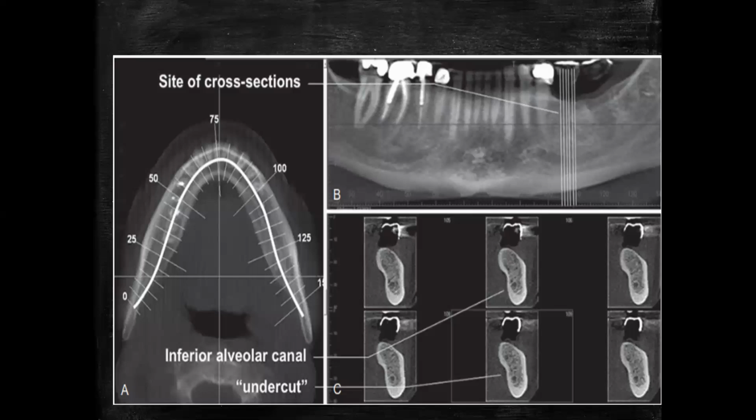In case the interslice distance is 2 mm and slice thickness is 1 mm, the distance between 100 and 101 would be 2 mm, and 101 and 102 would be another 2 mm. So I will leave those slices, and from 103 I will decide where I need to place my implants. This is how interslice distance plays an important role in the planning procedure.